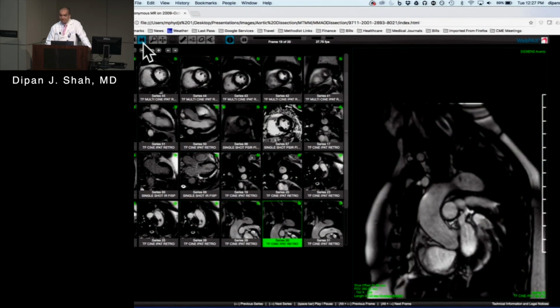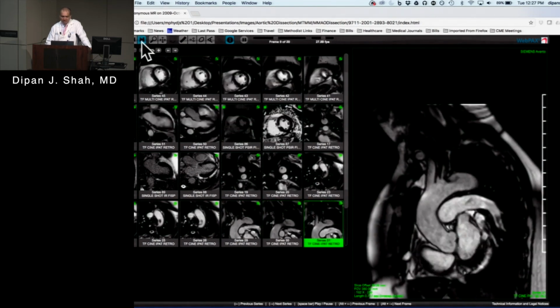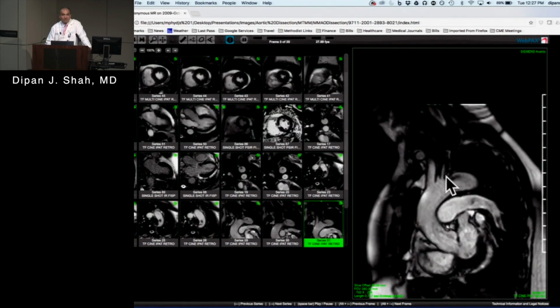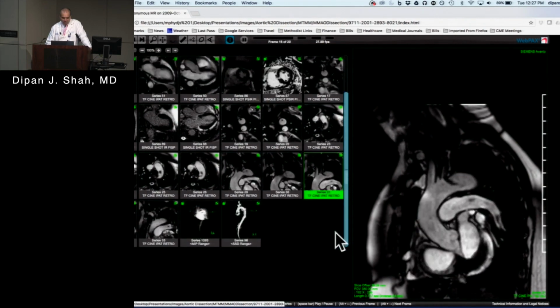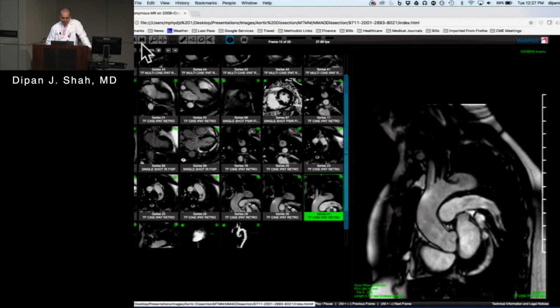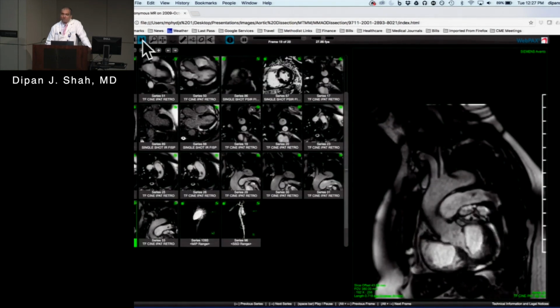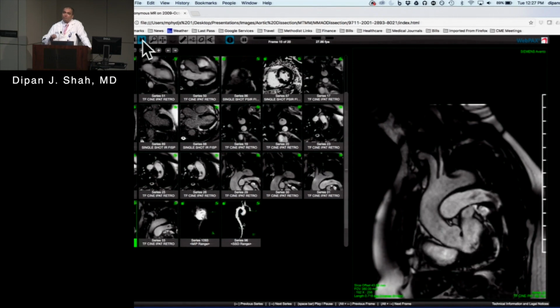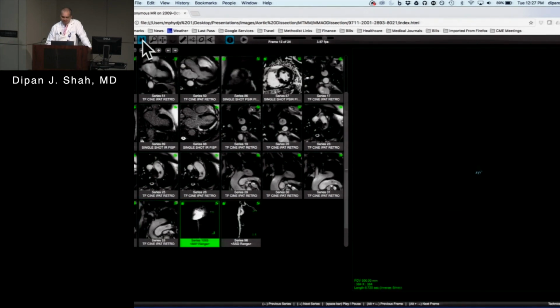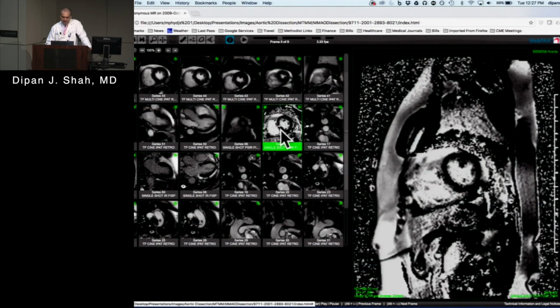Yeah. So now I think it's much more clear what you're dealing with is a thrombus that actually looks like it's plugging up the left subclavian right there. All right. So the other interesting things in this case were, let me just show you a couple other views here. See that on the initial CT scan. If you look, there's a filling defect in the subclavian. Yeah. But the problem then is you don't know if it is a dissection that's just causing slow, inadequate opacification.